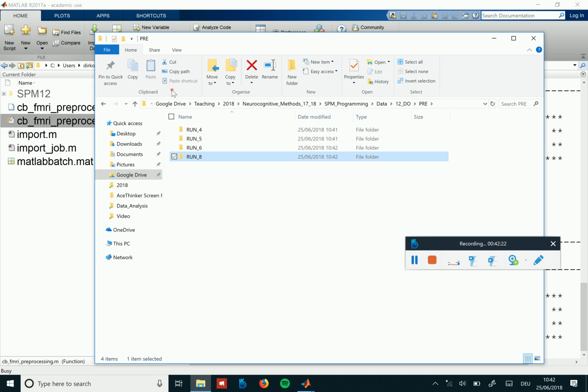It's doing its final stuff, and then we'll start again shortly before 11 to then split up the one Nifty file and then do some realignment.